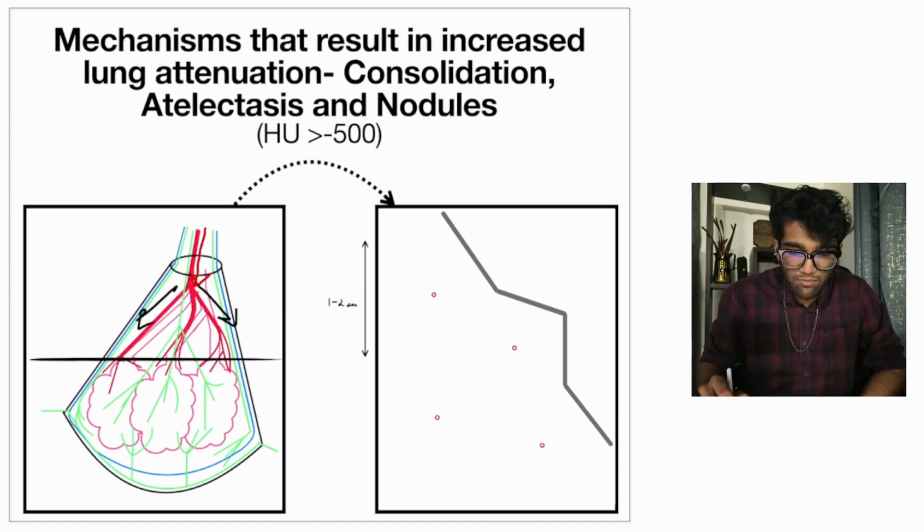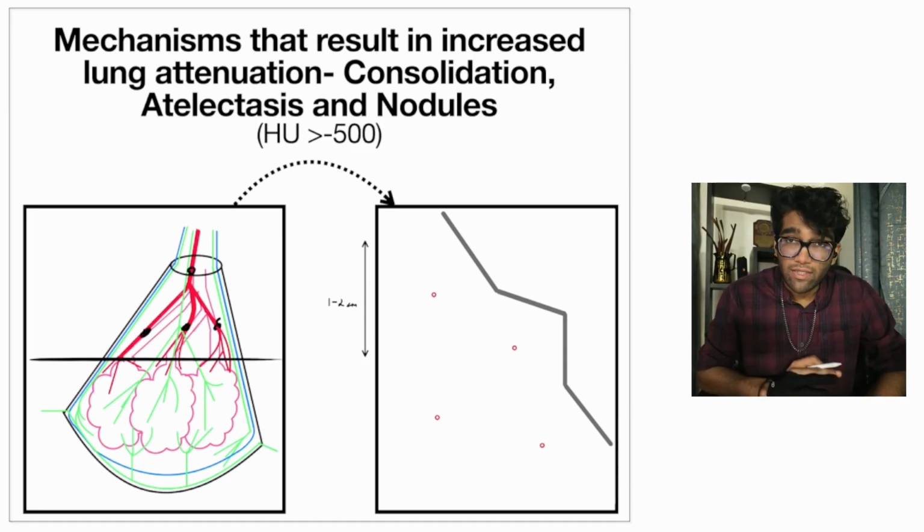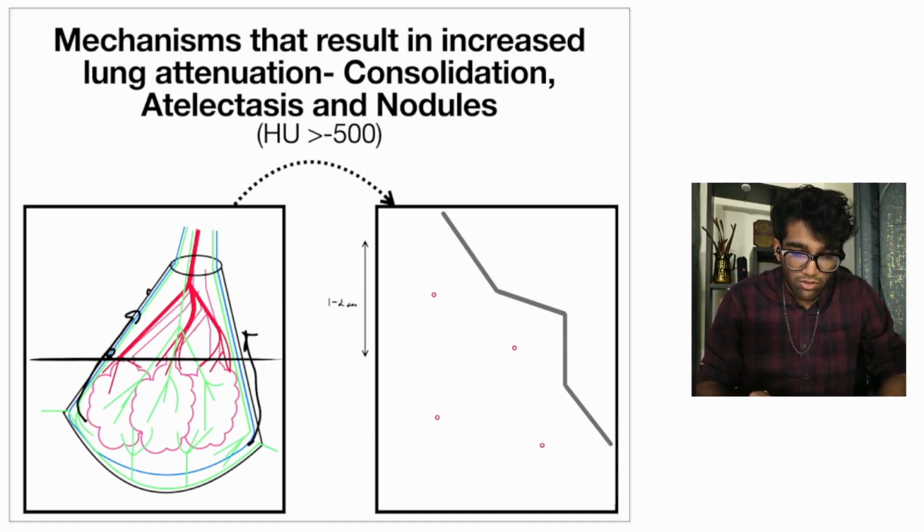So anything that comes through blood, hematogenously spread infection or say metastasis, would get stuck along these branches. That would produce a certain pattern. Similarly, if you have a lymphatically spread process, most immune processes, whether they are caused by an infection or not, would be spreading along the lymphatics. So they would go like this and like this, and they would get stuck along the lymphatics here.